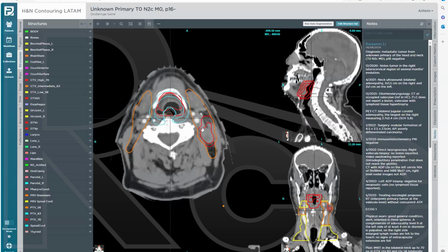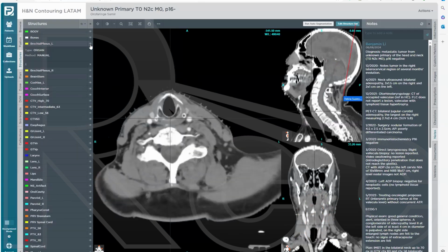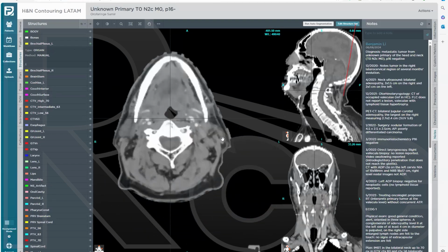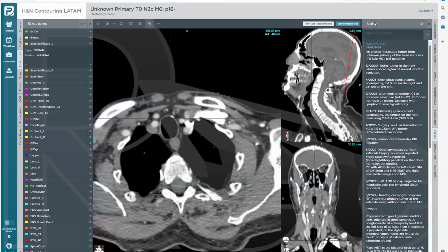Okay. So in this case, I brought this case up to just talk about the brachial plexus. Let me just turn all the volumes off here. We have the brachial plexus drawn here, someone has drawn it. And we know it's C5 through T1 nerve roots, right? So I'm going to show you what I do for the brachial plexus, okay? So I guess I'm going to use this.